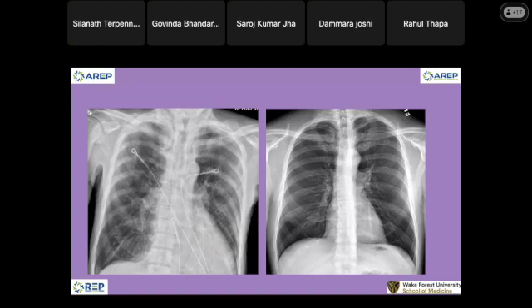I did show you a CT of this person, and we talked about the mediastinum, but I did not bring that up because today we're talking chest radiograph. So I did not bring that up. It looks normal to you. So when you see that, the few things to think about is systemic disease.